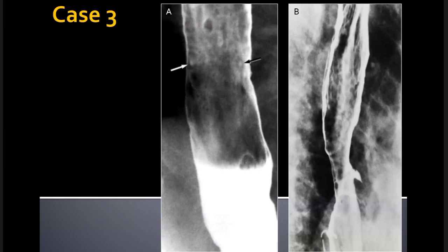Any other thing following on from what you said before about GERD and reflux? Any other thing that you tend to get in the lower esophagus, as you've mentioned? Ma'am, there is a complication of GERD, which is Barrett esophagus, in which there is a velvety appearance of the distal esophagus. Good. So, do you want to summarize findings and then tell me what you would do next?